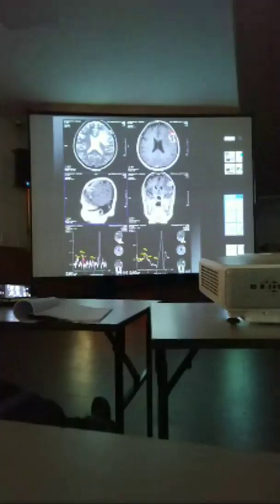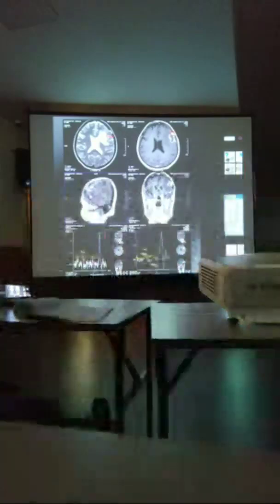It may involve the bone also. You can see the temporal bone is involved and you can see the cortex is involved and the low signal is a very classical manifestation in T2, and only a lipid peak is there, not the rest of the metabolites. So this is the manifestation of TB osteomyelitis, cerebritis as well as leptomeningitis.